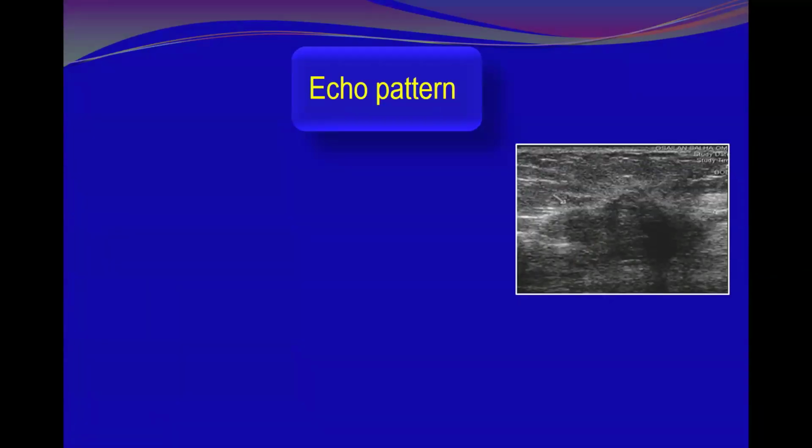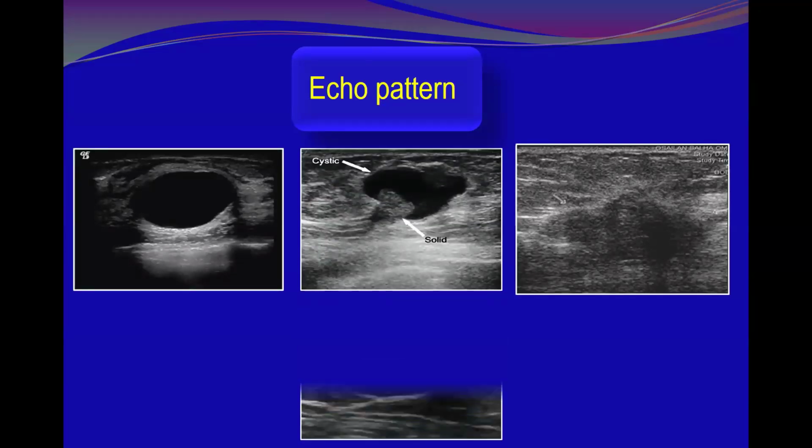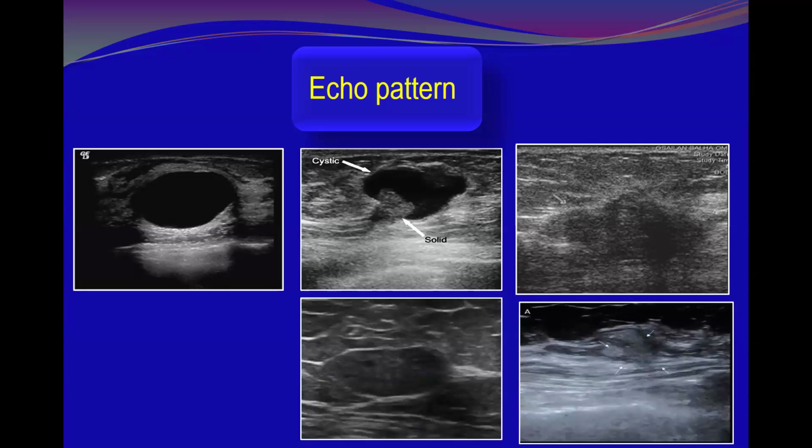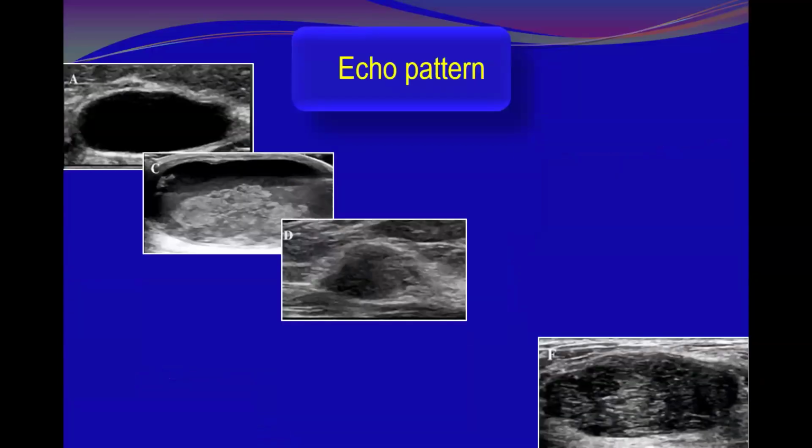Okay. And what about this one regarding echo pattern? It is heterogeneous here, and complex, isoechoic, hyperechoic, and hypoechoic.